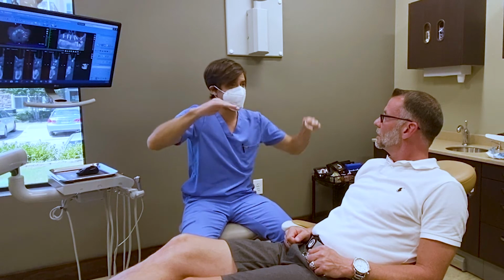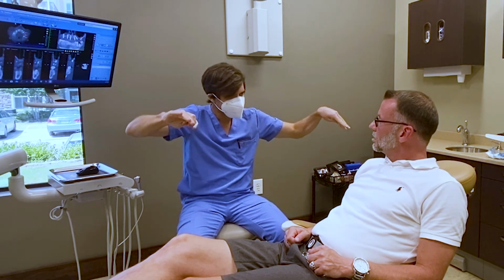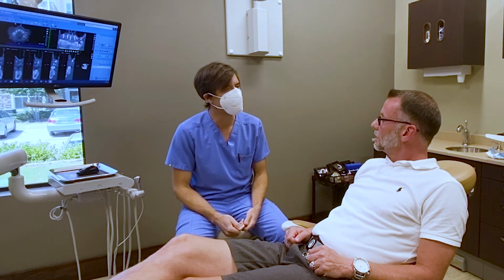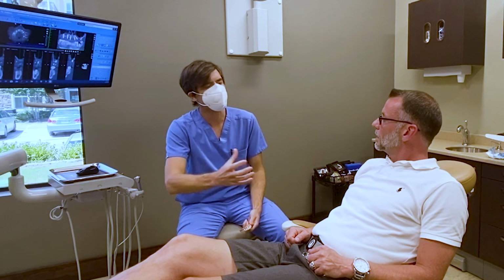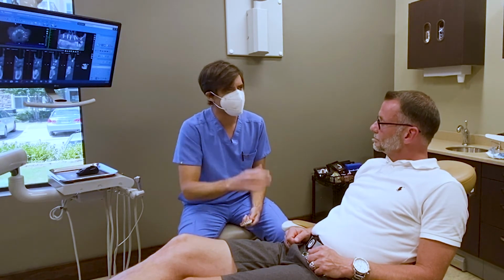But if you have everything flat against flat, this is almost flat, you can have the divergence, and it's good. That's why we call them multi-units, because you can restore multiple implants together without any issue of that angulation. Thank you for finally explaining that to me.